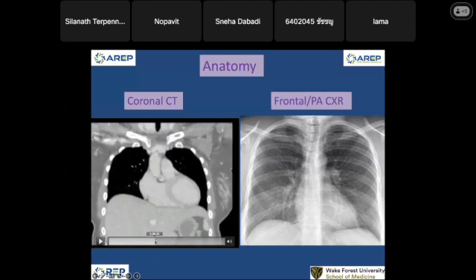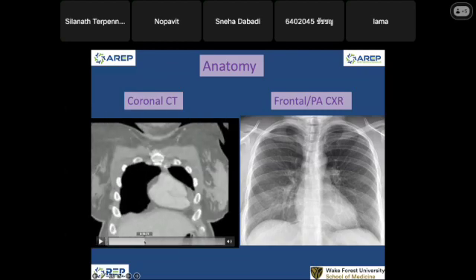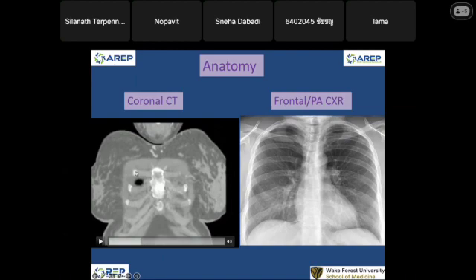I'm going a little bit further. Okay, that is still my clavicle, and ribs here. Look at the ribs. Yesterday I showed you that the ribs have two parts. The anterior part attaches to the sternum and manubrium, or the xiphoid process here. This is cartilage. Normally we don't see cartilage on the chest radiograph until it has calcification in an elderly person. So this is the cartilage, or anterior aspect of the ribs.